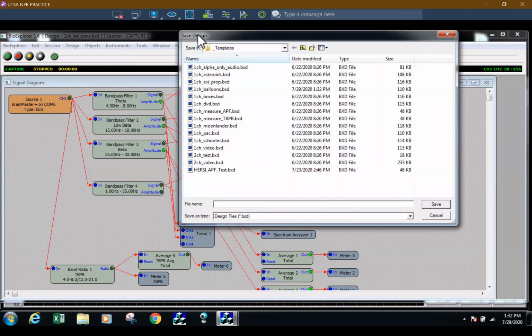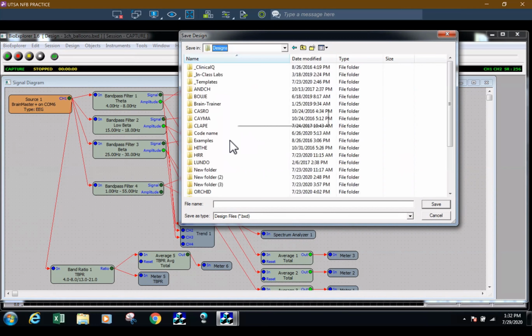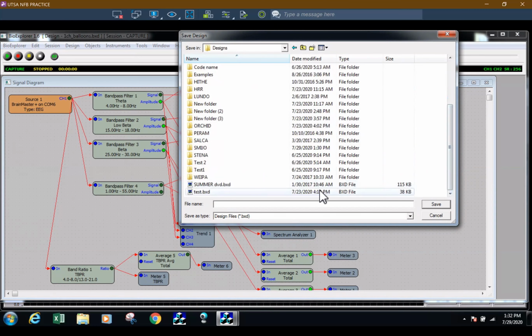and you're going to find his own folder. So see how it popped open the templates file again? That's because that's the last place we were located in when we opened this box. And so we're actually going to go to the Designs, find his folder, which is SMIJoe. Let's see, there it is.